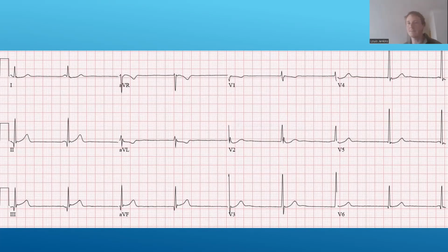But yeah, and I think it's absolutely okay to start your analysis with that sort of approach, as long as you go a little bit deeper and don't just hand your ECG back and go, yeah, the vibe's off. I hope that makes sense. But anyway, now we are going to look a little bit deeper. Let's start with our lateral leads.